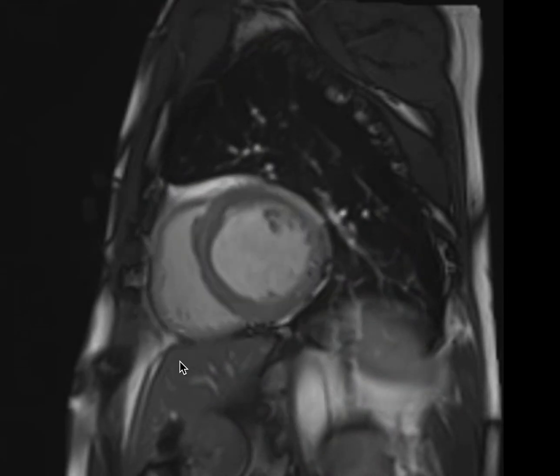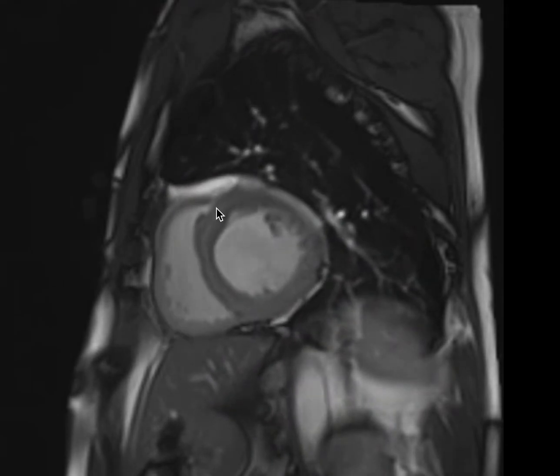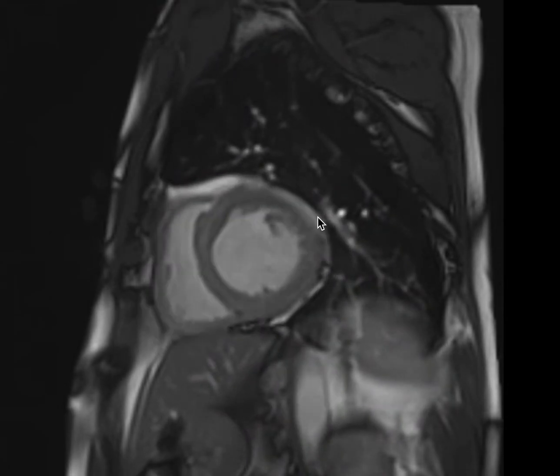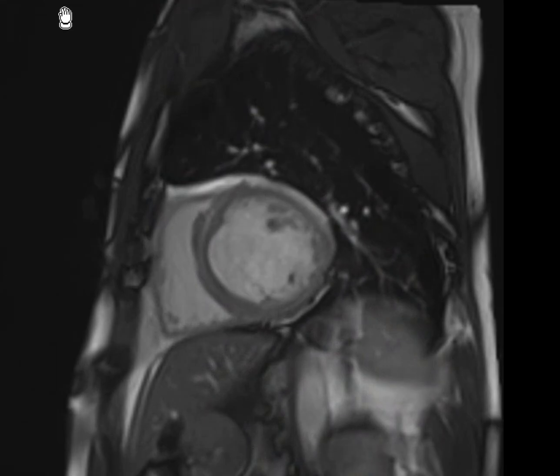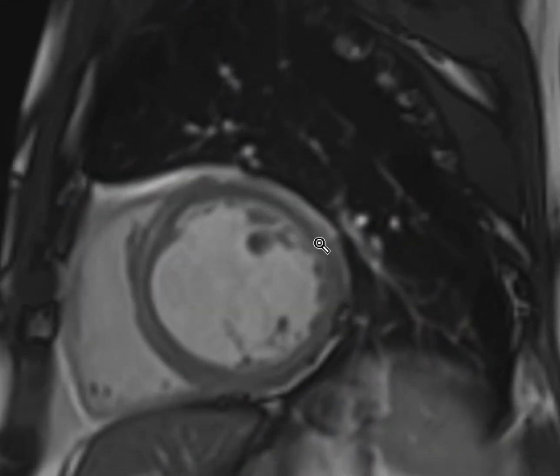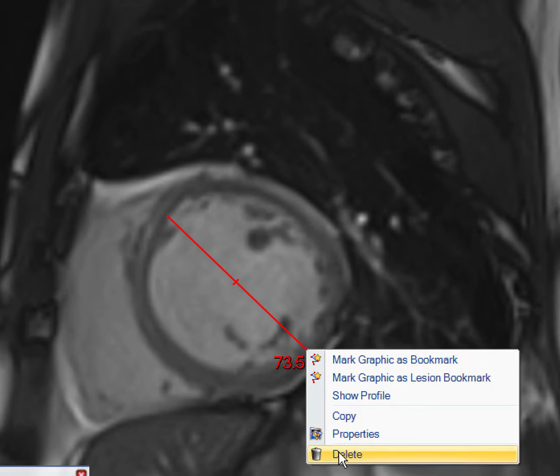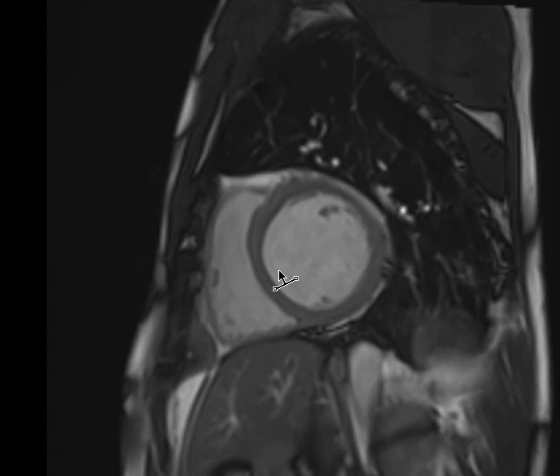so whether it's hypertrophic cardiomyopathy and its differential diagnosis, or is it dilated cardiomyopathy and its differential diagnosis. For instance, in this case, as you may see here, the left ventricle is dilated, so the indexed left ventricular volume was 120, and on MRI we could still measure the diameters in order to correlate well with the echoes. So it's around 7 centimeters, and usually we measure this diameter on a cine image basal cut where there is no partial volume from the LVOT.